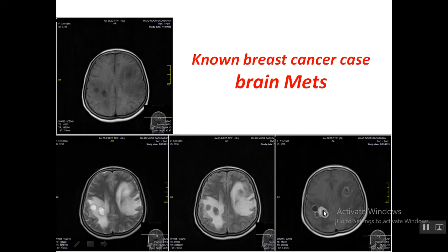Metastatic lesions could be small, but edema around the lesions is very extensive and disproportionate to the size of the lesions. When we encounter more than one lesion in the brain, one of the most important differential diagnoses, especially if the patient is a known case of cancer or the patient's age is high or old, is metastasis, or metastasis of a tumoral lesion, which is one of the most important impressions.